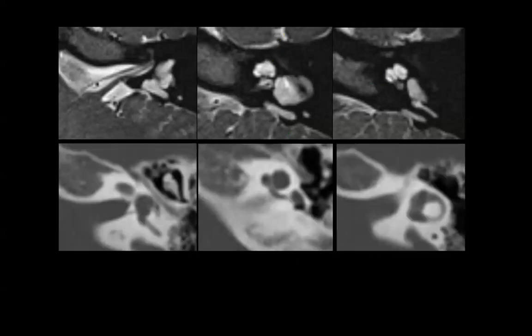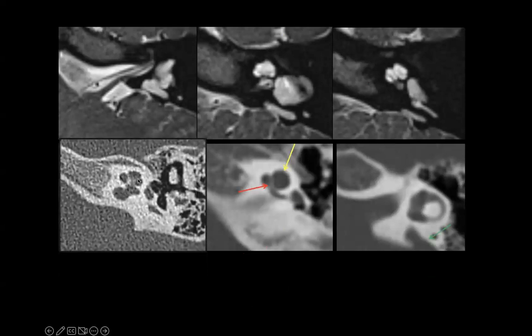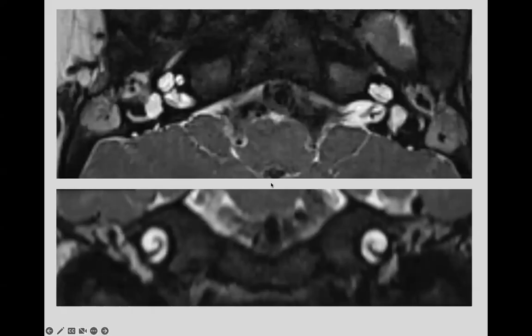And this is the CT. Again, look, the upper part of the cochlea looks like a little balloon, and you have a dilated vestibular aqueduct. Remember, when it's CT, we call it vestibular aqueduct. When it's MRI, we call it endolymphatic duct and sac. They are the same thing. It's just we image slightly different things, okay? And again, look at the difference from a normal cochlea. So when you see something like that, remember Pendred.